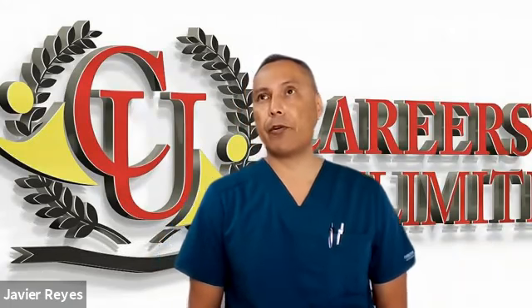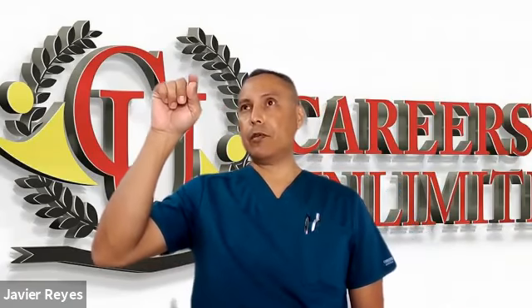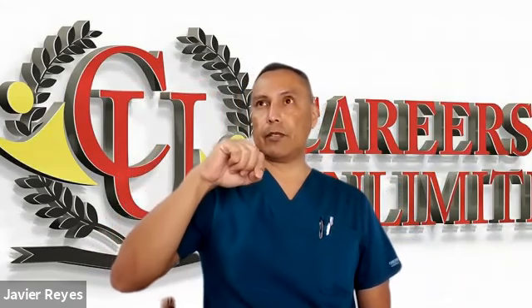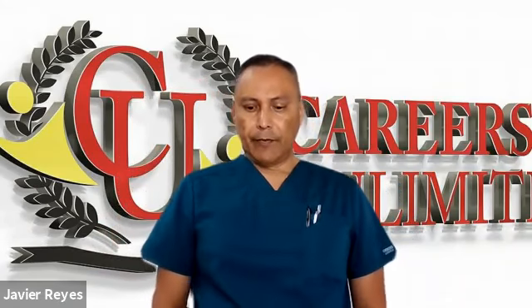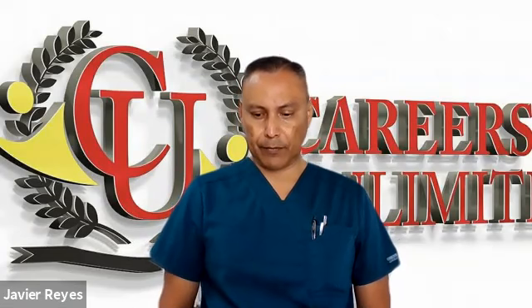Remember the J point is where the QRS is going back up to and eventually to the T wave. So you come backwards. If it is going down, negative, it is a left bundle branch block. If it is going up, positive, it is a right bundle branch block.